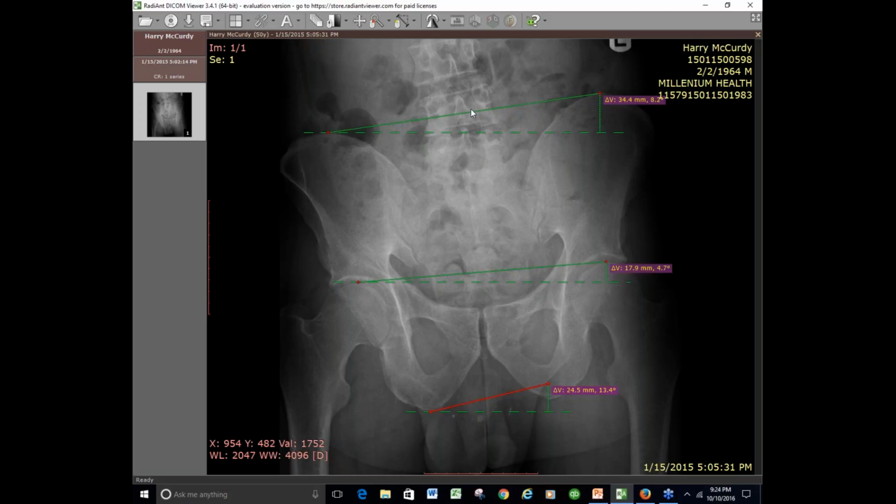Now I don't have two parallel lines anymore. And that's actually not even a 24 millimeter lift, because there's already 10 millimeters down here. So to actually bring that up to a 24 millimeter lift, I'm doing 24 plus 10. That would be 34.